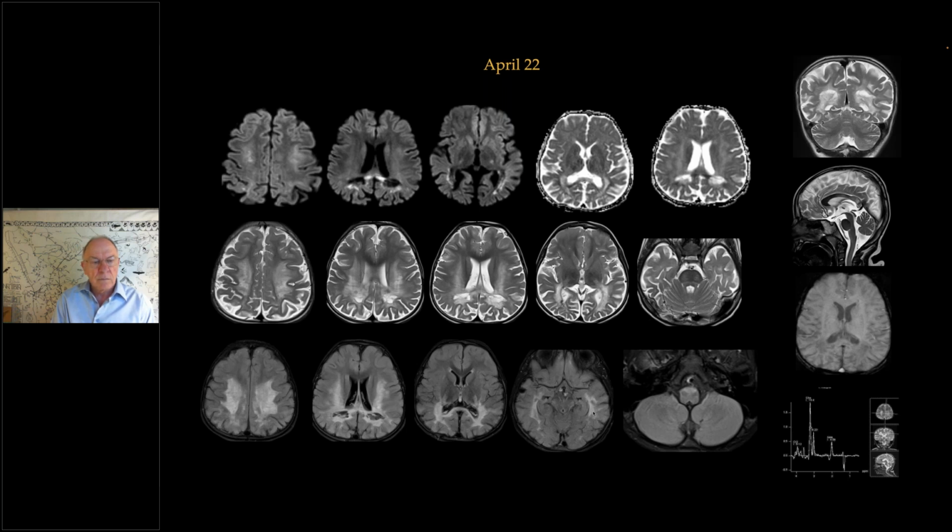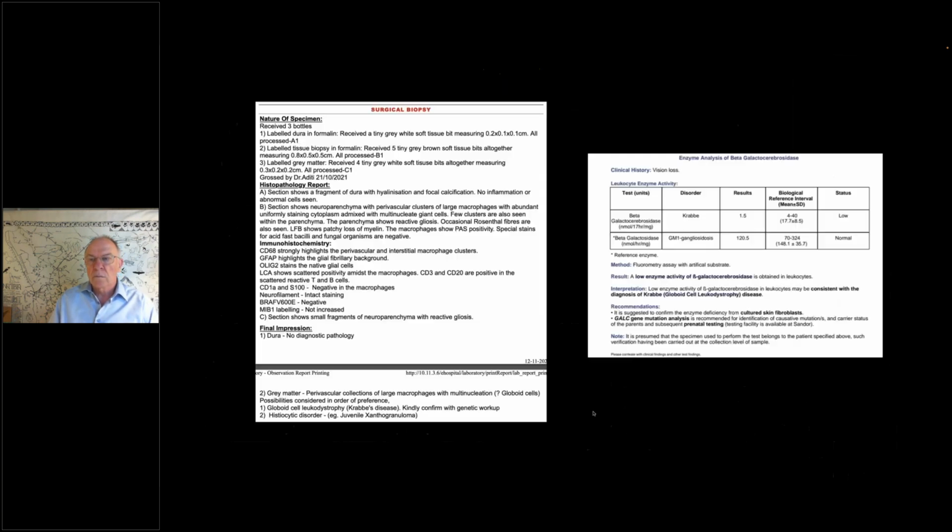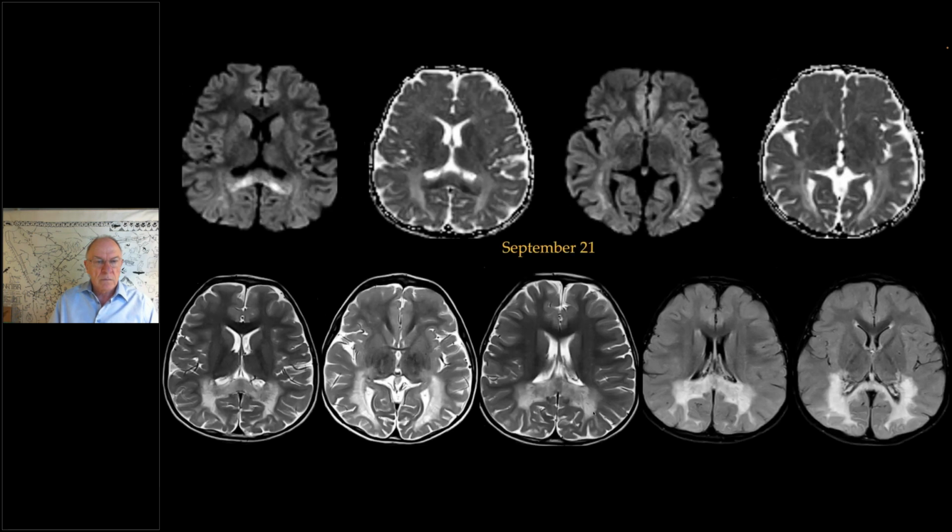Okay. I think actually end stage Krabbe's, which I have had, I'm sure Eugen has also seen, is almost like the devastating effects of hypoxic ischemic injury. It could be quite global as well. Show us the thalami a little more closely, if you have any cuts through it. Okay. That's fine. It is quite localized, but I think cavitation doesn't take us away from end stage Krabbe's.